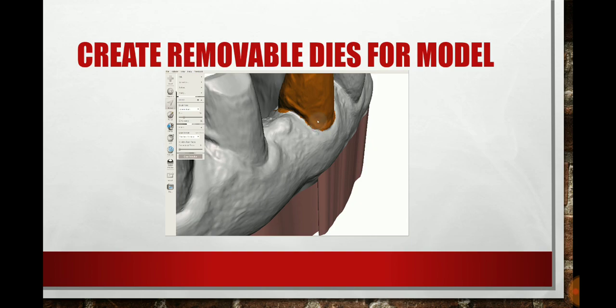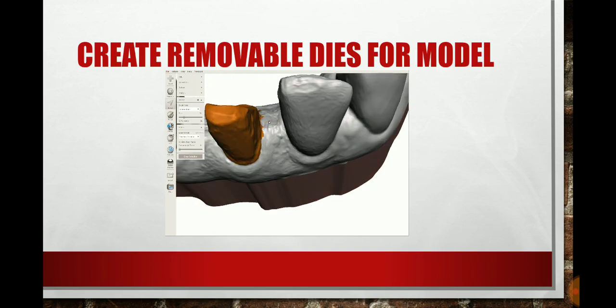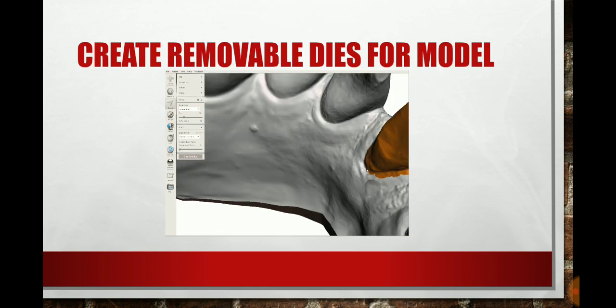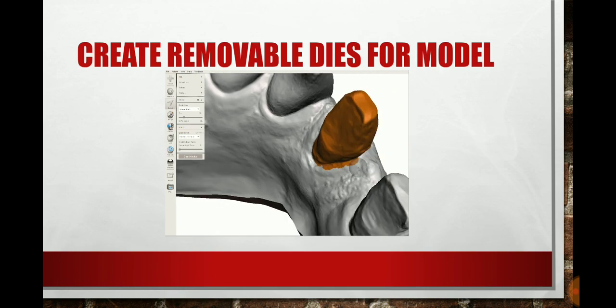Once you're done with this, it's going to take you just a little bit, but you're going to go ahead and use your other tools in the drop down, and it'll show you here in just a second as it cleans it up. But the next one, like we were talking about initially, is that you're going to optimize and then smooth the boundaries. And once you optimize and smooth those boundaries, now you've got to really get a good look at each prep. Okay, so this is what it's going through right now, cleaning up those margins again.